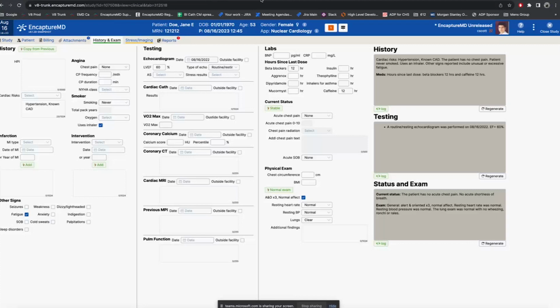And then, I should know my patients, but it's handy to see that when you did your interpretation of this as the attending, you knew these risk factors. And it's also important for pre-test probability, that the attending physician who's reading it, using Bayesian analysis, should be able to know, is this patient high risk to begin with? I mean, if they're a 21-year-old with no risk factors, and they have a positive study, it's very likely going to be a false positive study, but it still needs to be evaluated.